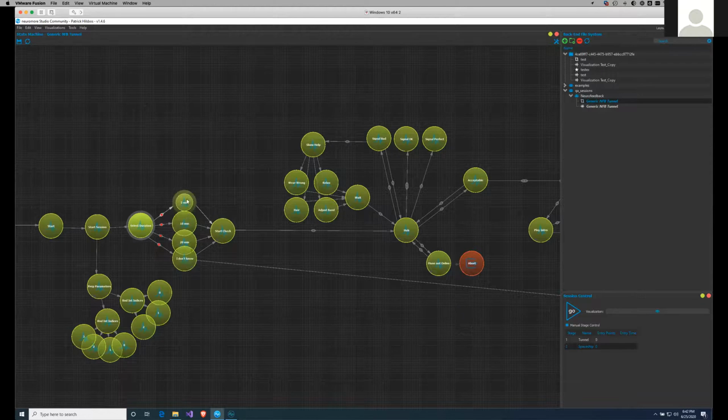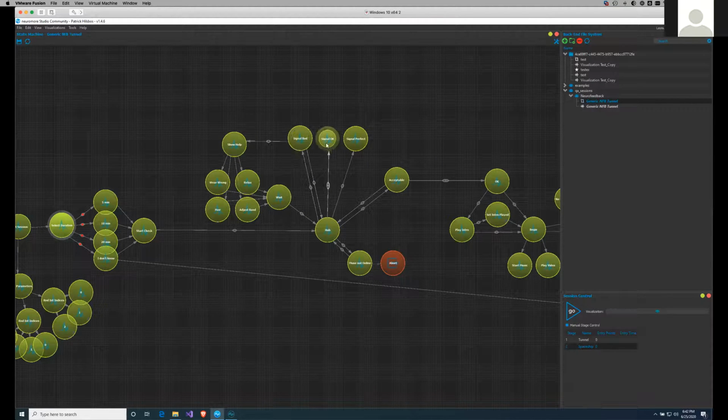Then it asks the user how much time the user has. It does some initial checks in here and determines, is the signal any good? Oh, the signal is perfect, it's acceptable, and so on. In case the signal is bad, it shows some recommendations, like, oh, maybe you put on the amplifier the wrong way, or maybe you just need to relax your head muscles a little bit more. If it's still bad, it shows, oh, maybe there's some hair in between your head or your skin and the sensor. And last but not least, maybe you also need to just adjust the band, adjust the sensor, and so on. Those are some of the troubleshooting advice that we came across that really helps the average user get it up and running.